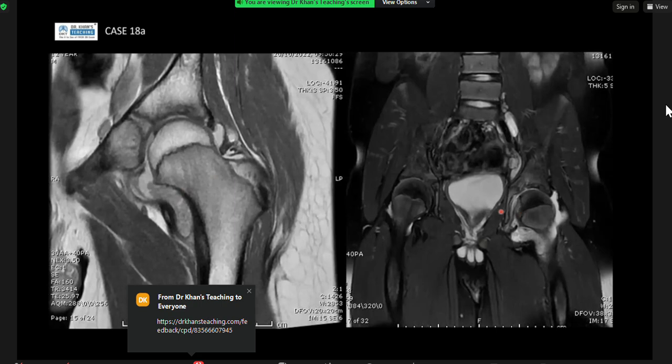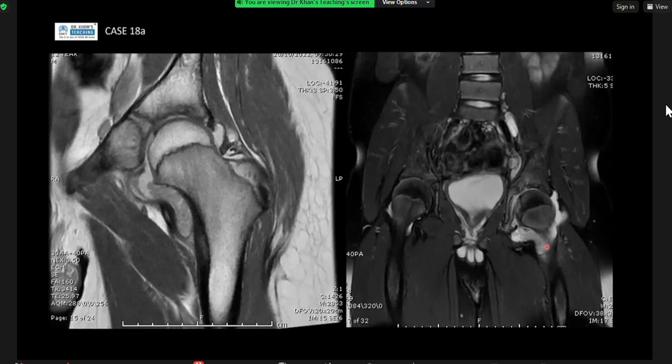The interesting thing here is there's not much in the way of marrow edema. And if this was, of course, correlated with clinical history, although sometimes it can be hard because, as I said, systemic JIA can have fever and raise ESR, CRP and stuff. But septic arthritis is going to be really painful, often an acute flare of JIA, or juvenile idiopathic inflammatory arthritis.